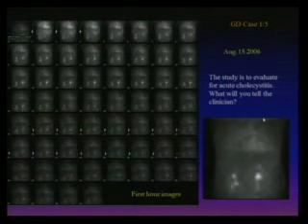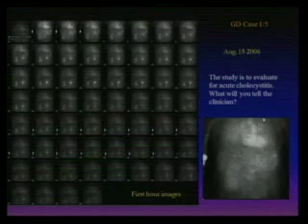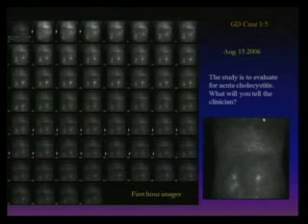What's wrong in this image? You said you do not see the gallbladder. What other thing do you see? You see the kidney. Do you usually see that clear a kidney? Do you see the liver? Why? So that's something wrong, right? Because normally you should see very uniform, quick uptake in the liver. And you may see a little bit of tracer in the kidney, but not like this. This is like a kidney scan.